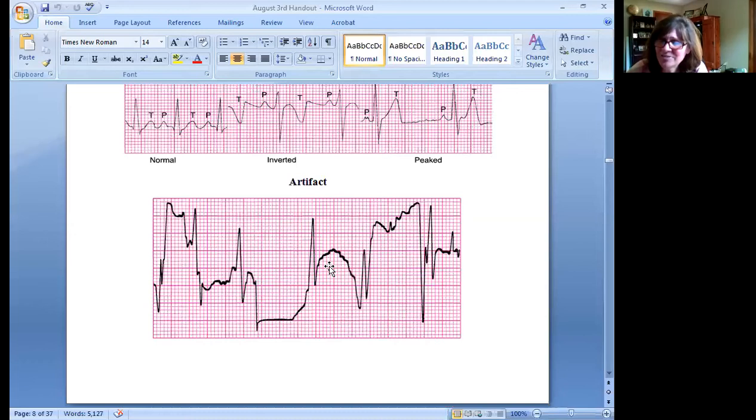And again, at the bedside monitoring, they're probably only going to have those 5 electrodes on. The limb leads, that can be on the upper chest and lower chest, and 1 V lead, maybe a couple of V leads. A 12 lead would be just a snapshot in time where the person comes, puts 10 electrodes on, and that's a different story. But this is artifact. They just popped a lead.